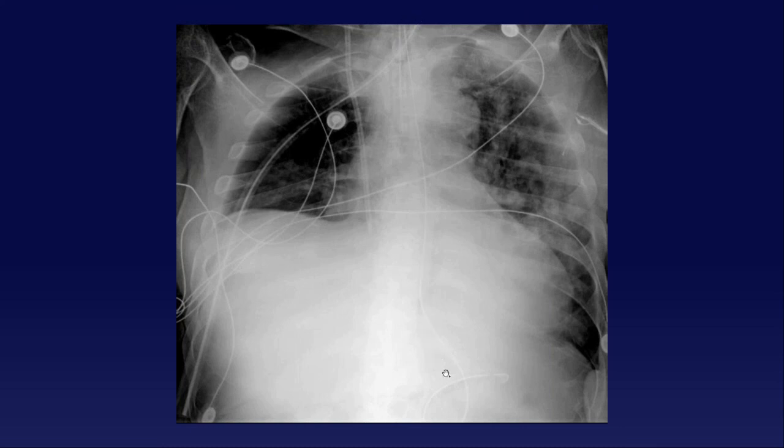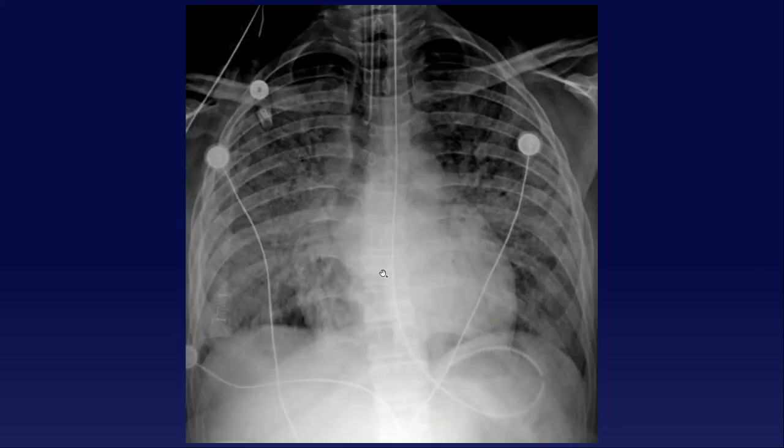Now shown here, this is pretty normal. You've got your NG tube coming down, it's coiled, tip overlies the stomach. That's where it should be. A few interesting things going on here for extra credit for you guys. He probably has some right lower and middle lobe collapse or elevation of the diaphragm, because you see how this looks kind of low relative to the right diaphragm. The heart's down here, so they probably have collapse of both on this side here. Okay. Another example, ET tube tip there.